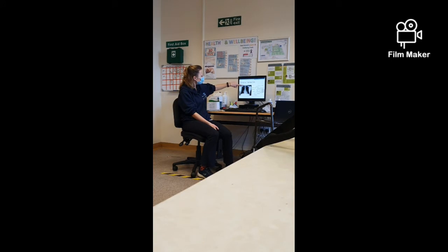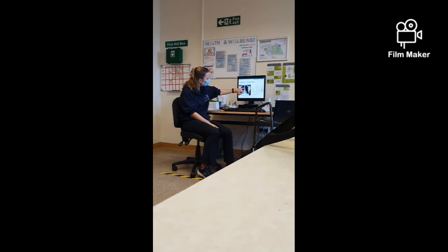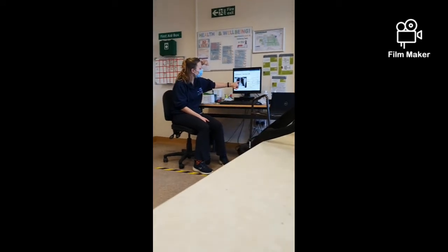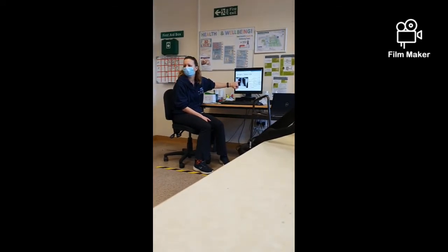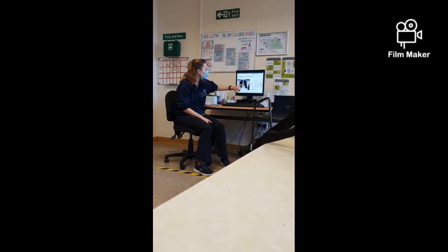What we're going to do is have a look at the little diagram. So you've got your trachea, the airway down there, and then that branches out into your bronchus there. You've also got this little notch here. Can you see that little notch that goes around here? Does anyone know what that is? Is it the aortic arch? Yep, the aortic arch, fab. So that's your aortic arch there.